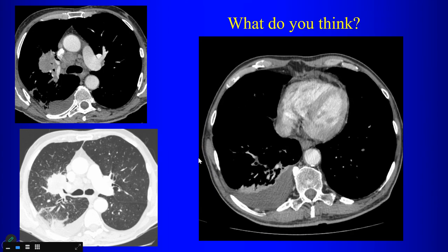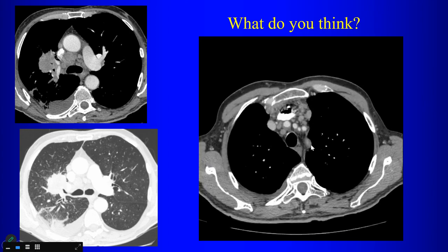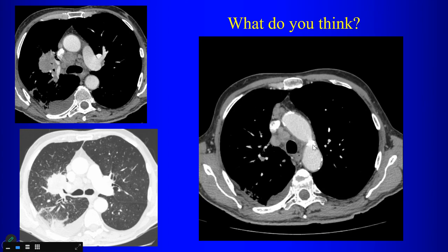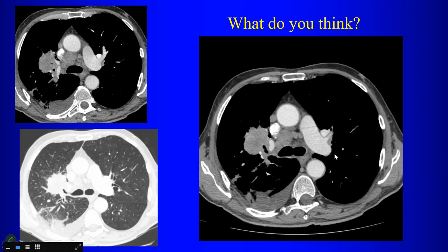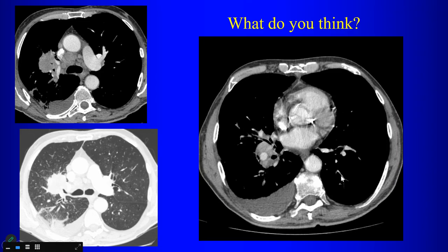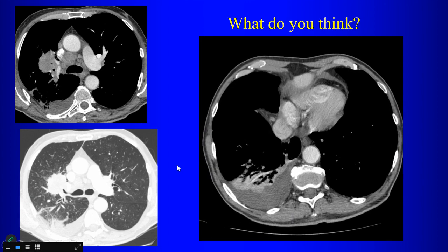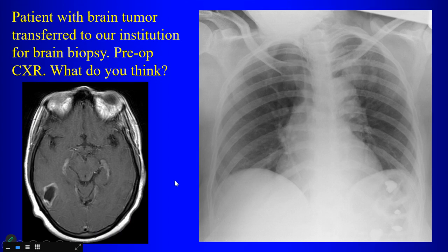What did you say? Is there some in the left lower lobe, segmental? So let's see, follow it down. Left lower lobe. Oh, yeah. Okay. So, very important, look at the pulmonary arteries in all patients with a history of cancer.